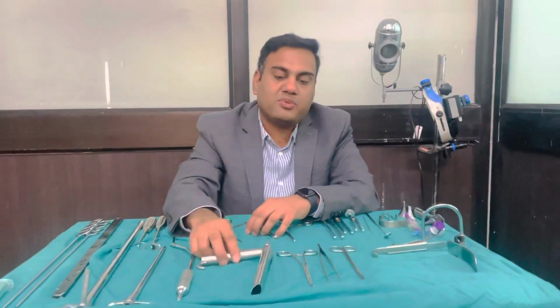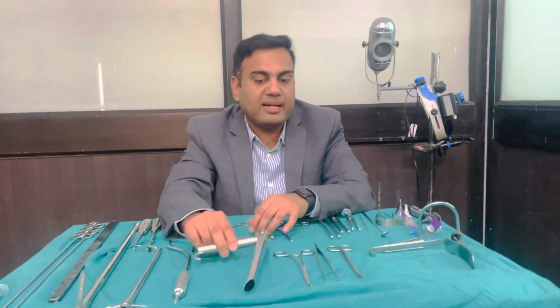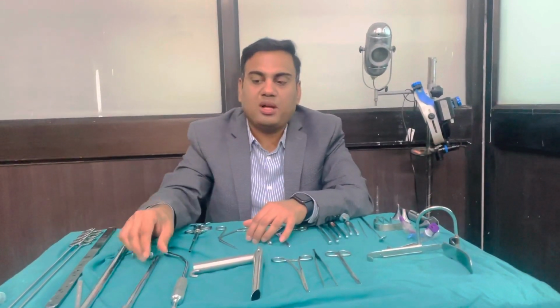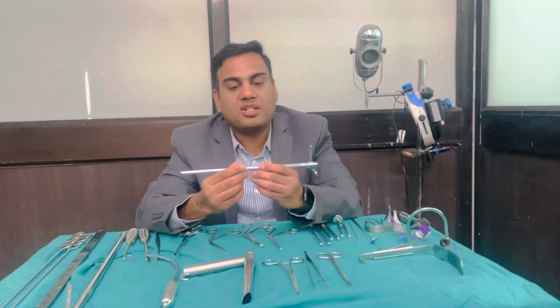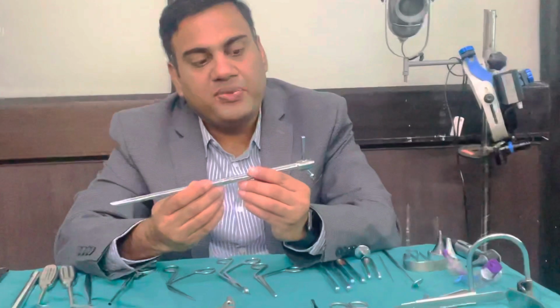So continuing with the instruments that are important for undergraduate examination, in the last video we saw the difference between direct laryngoscopy and indirect laryngoscopy. Now we're going to continue with other scopes. This is a Chevalier-Jackson bronchoscope.